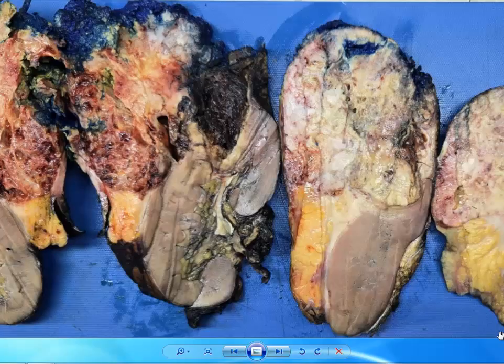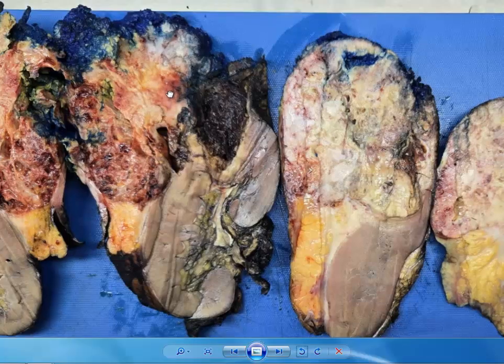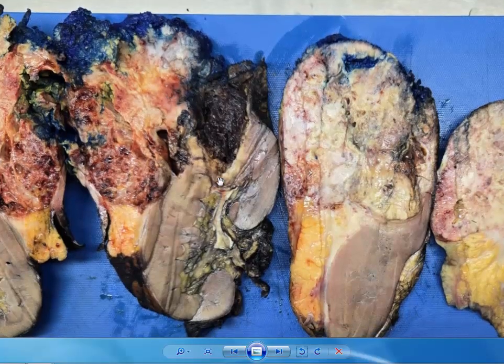Today I'm going to present a renal tumor of a 40-year-old male with a previous biopsy, and they decided to take it out. Unfortunately, the patient was metastatic, and this was a palliative surgery. As you see, the tumor is well expansive, rising exophytic from the kidney as an exophytic mass.